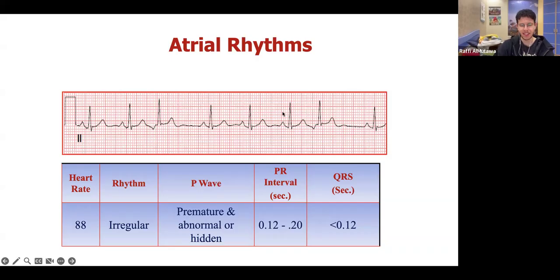Or sorry, did I say 8 by 10? I meant 8 by 6. I'm sorry. So you're going to get a different number than here, but you can identify that it's irregular. So this would technically be 48. Is this actually 48 beats per minute? No. But again, for some reason, we're supposed to do this. We know it's abnormal. There are other ways to calculate this. It's a little bit weird, and you're never going to be asked to calculate it, but this is just for your sake. But you can tell that this is something irregular. The question is what?